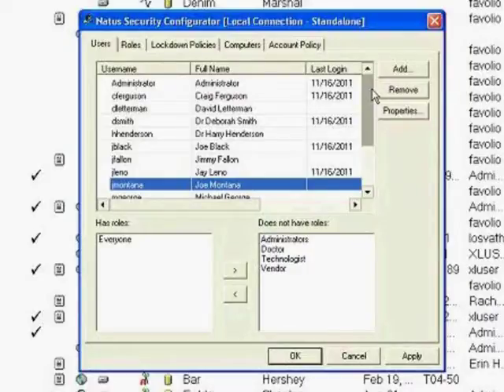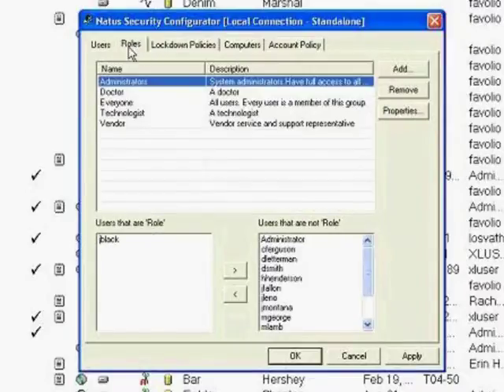The other way, which is the way that the Natus security works, is rather than creating an individual profile for each individual user, so if we had 50 users, rather than creating this individual profile for 50 users, let's create some groups of users. All right, so by default these groups, I'm calling them groups, but in the security framework we call them roles.